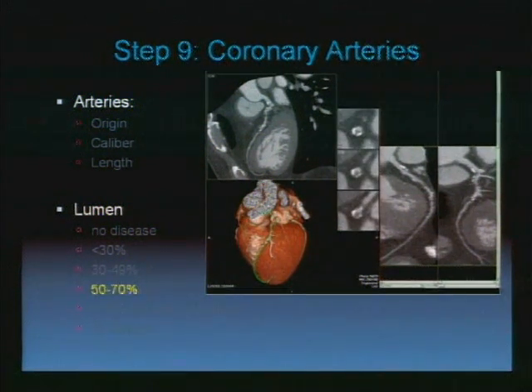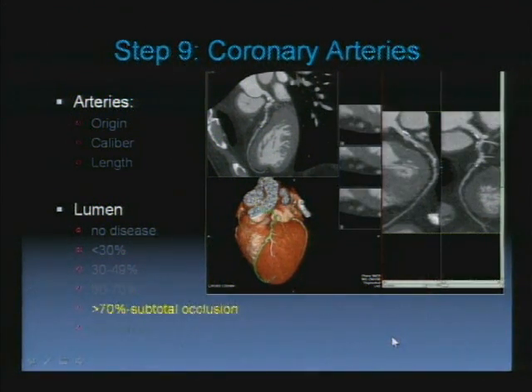The next category is someone who's got 50 to 70% disease, and you can see, again, same patient. Here's the lumen with contrast, here's non-calcified plaque, and here's this eccentric calcified plaque. So we're getting in the category now, the cardiologists are now starting to get interested in this patient. In patients who you see very little contrast, but you can persuade yourself to see a dot, or the linear extent of the abnormality is less than a centimeter, chances are it's between 70% and 99%.